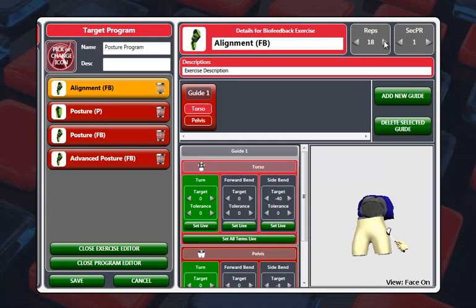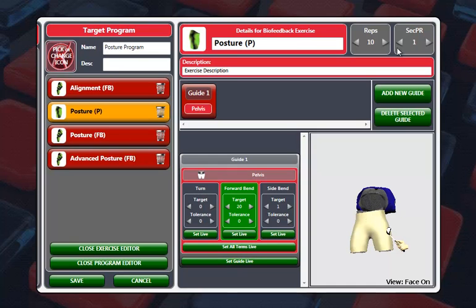All right, might want to go to 20 on that one. I can also change the seconds per rep. So maybe I don't want them to hold it for an entire second for that rep to count down. I just want to go half a second. If they're doing some pre-shot routine, walking in and out, and you want to get it a little quicker, I might take these all down to 0.5 seconds.